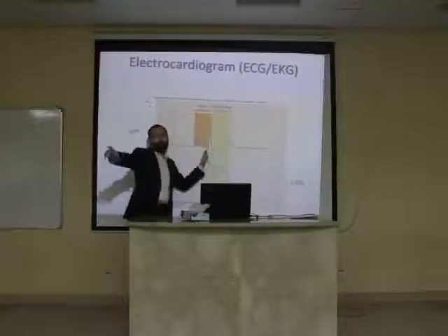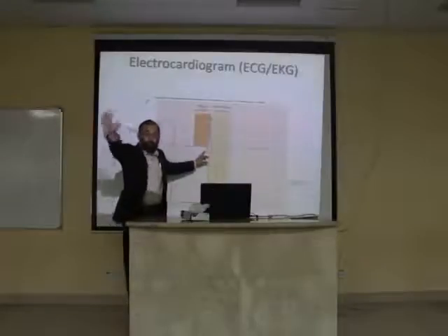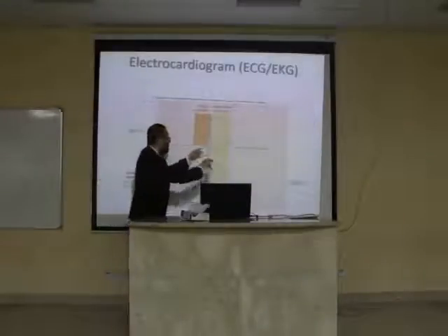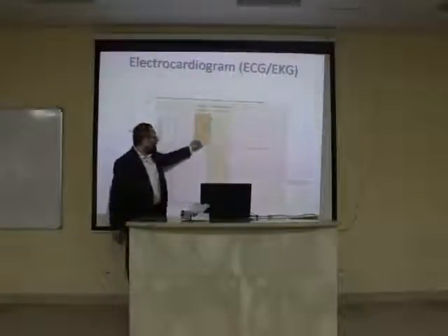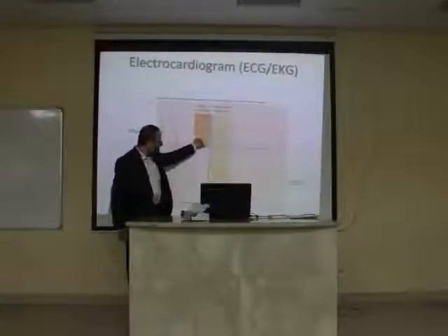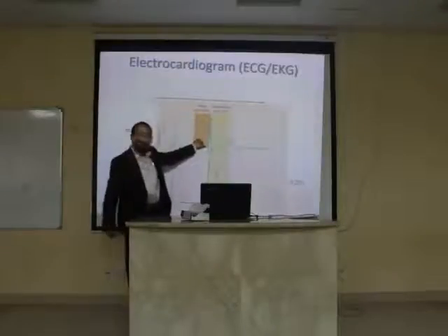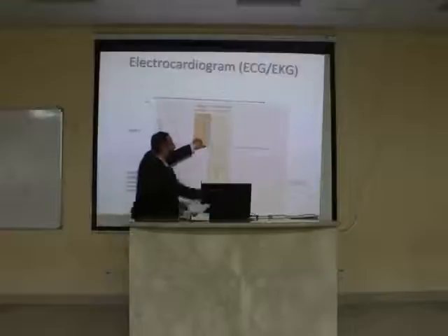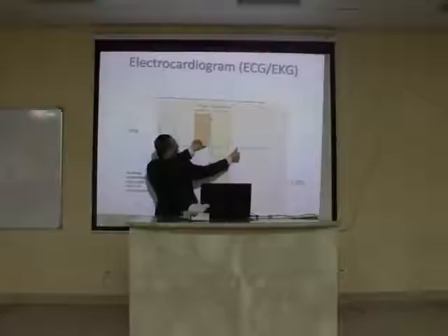Alright, I want to make another interval. Be with me, please, all of you at the back side. I want to make another interval now. I am starting from this point. Look at my finger. Do you see? This point. And look at my other finger. I am finishing at this point. Look at these two points, this point and this point.